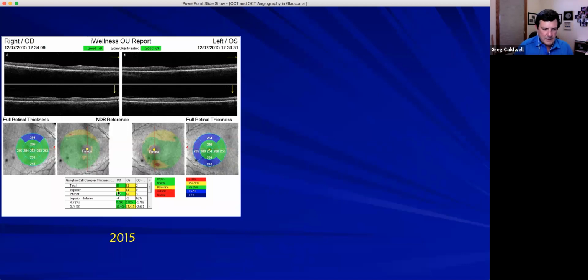Remember, 85 to 100. 83 to 81, 81 to 81, 85 to 82. 2 microns difference, 0, 3, 4, and 1. I don't really scratch my head, if it's a good scan, and let's all assume that they're good scans. There could be cornea edema, there could be something else going on, a cataract maybe causing a signaling issue, a patient couldn't hold their eye still. But let's all assume that if these are good scans, this is very symmetric.